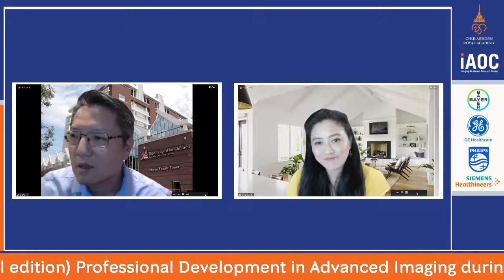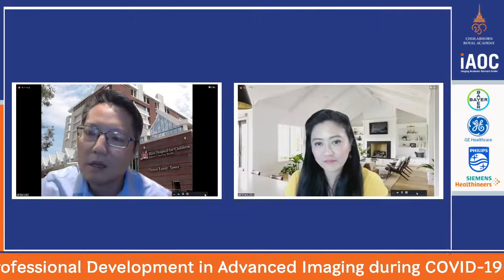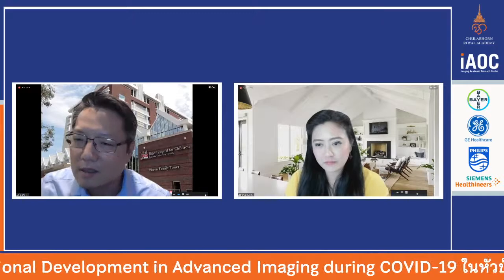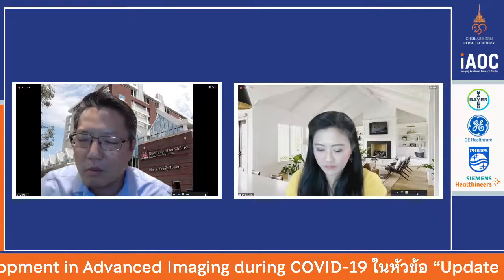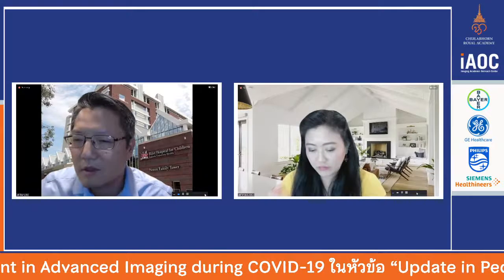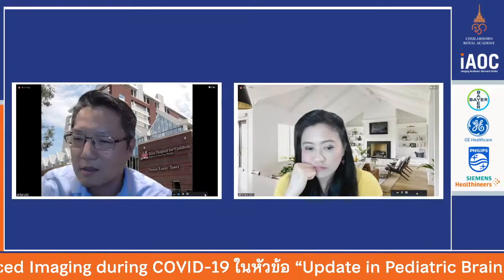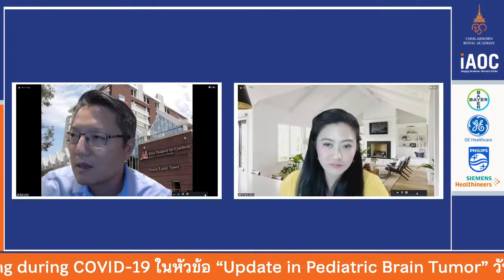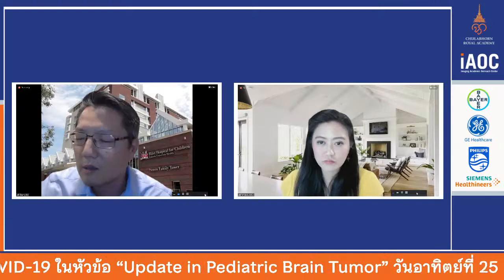Like we were talking about, even within medulloblastoma, if you have low ADC, it doesn't really help you with the subclassification. The group with a really good outcome, WNT, is also going to have low ADC, versus a really bad outcome group like group 3. So that quantification really isn't going to help there. When you're just deciding between a high grade or low grade category, that certainly helps. But again, there aren't really any published thresholds.